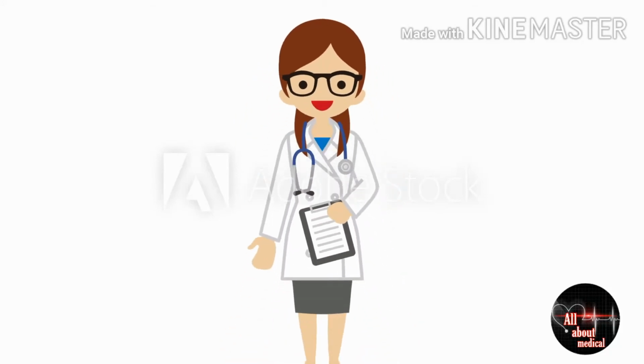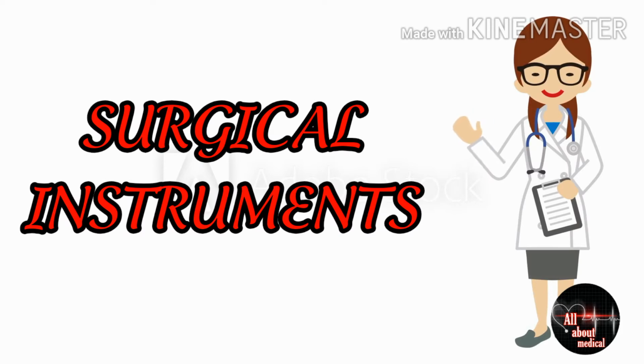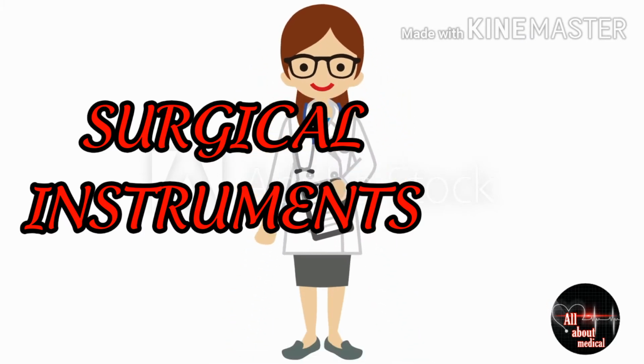So in today's video we are going to discuss surgical instruments, which are very informative and also very important from a competitive exam point of view. So must watch the video till the end.